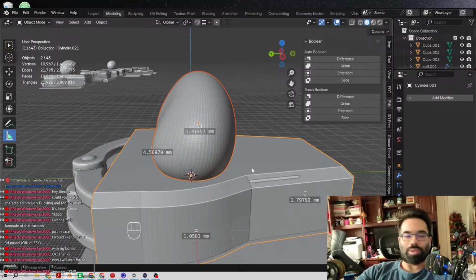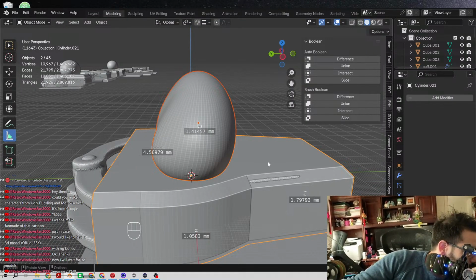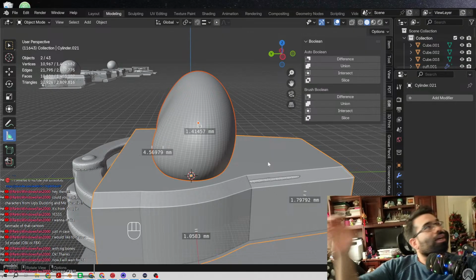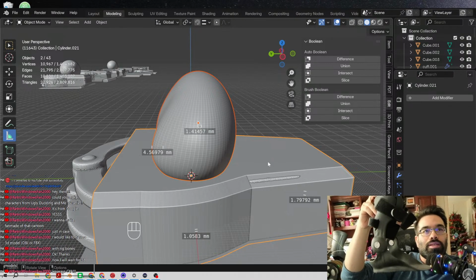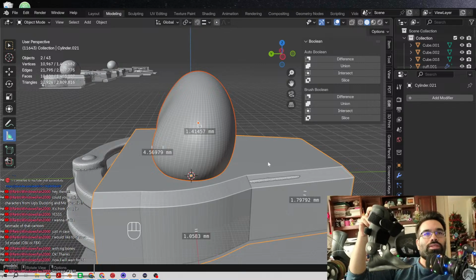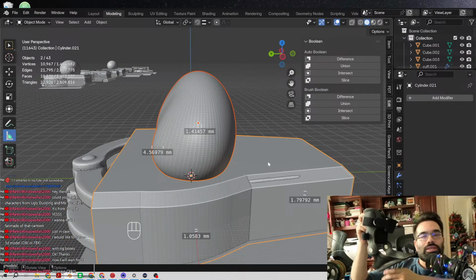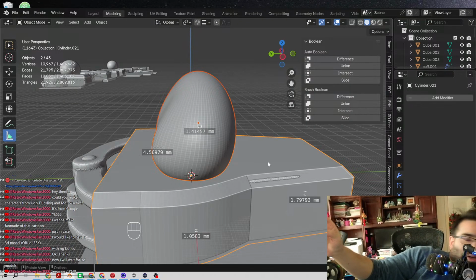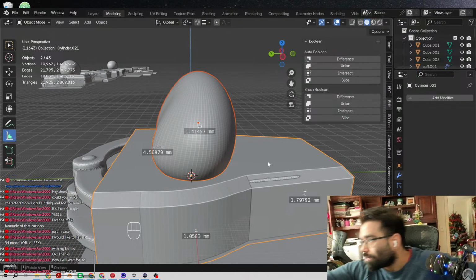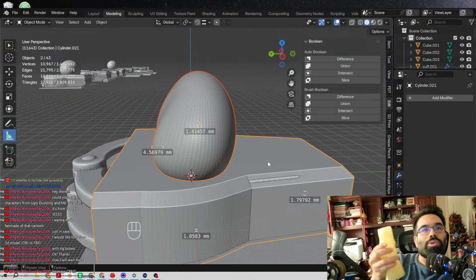I do prosthetics and braces. So you've got these braces here. This is called a crow boot, right? And this thing is 3D printed. You know, so it's modeled and 3D printed. But I work on hands. There's a hand. This thing broke.